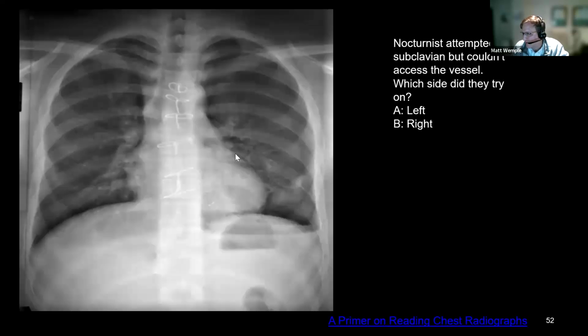And if I go back to this one, I would say right here we see dark, this white line, and then dark behind it. So that's why this is that pneumothorax on the left side.